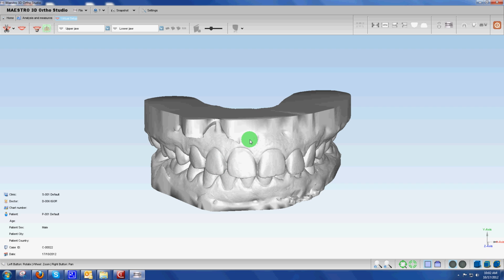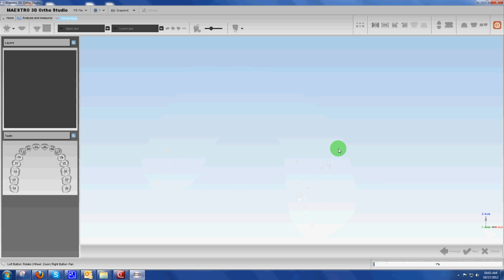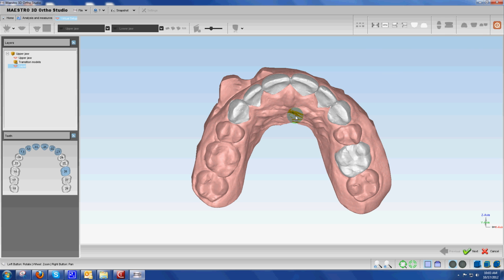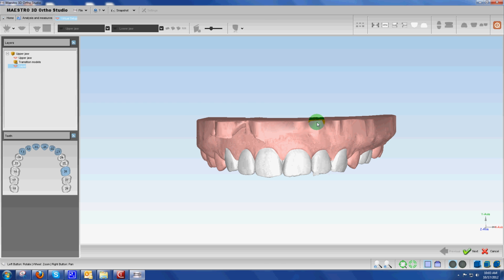This is the original model, but the setup had in fact been done. And here we are now able to produce a sequence of models based on the setup that we produced. Here is the corrected setup. That's the upper. And it's ready to move. Well, we'll deal with the model manufacture in the next tutorial.